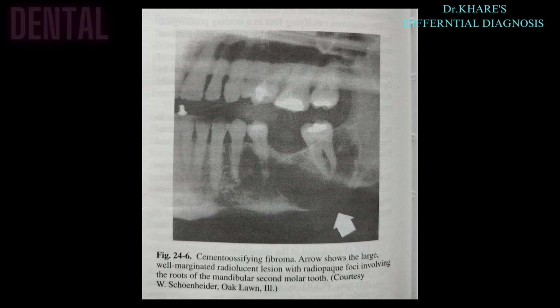This is the panograph showing cemento-ossifying fibroma, where the arrow shows the large well-marginated radiolucent lesion with radiopaque foci involving the roots of the mandibular second molar tooth.